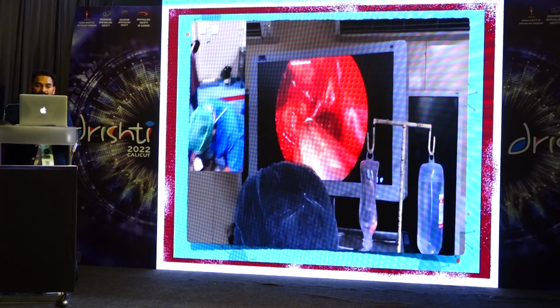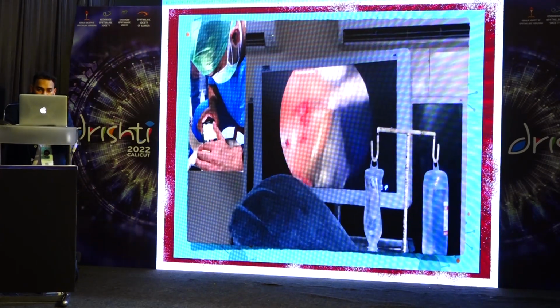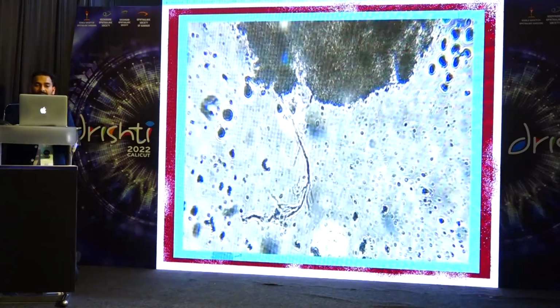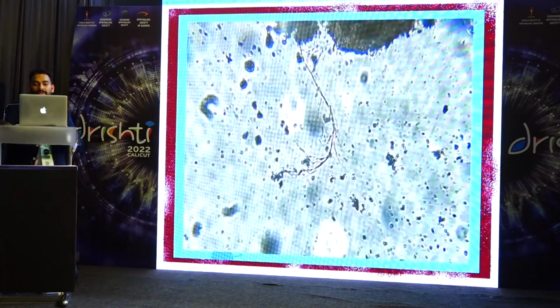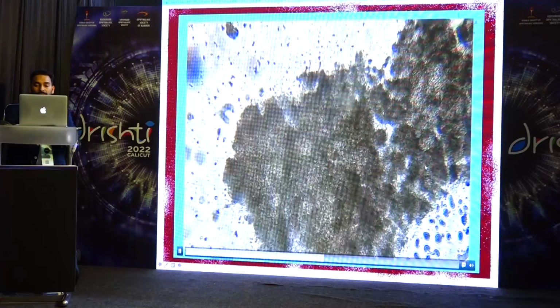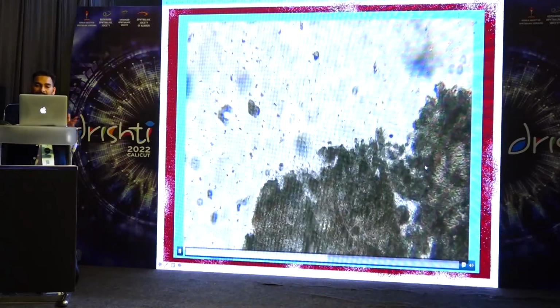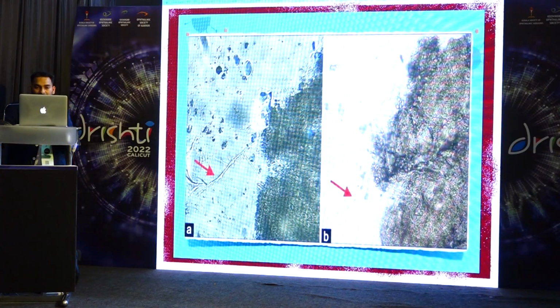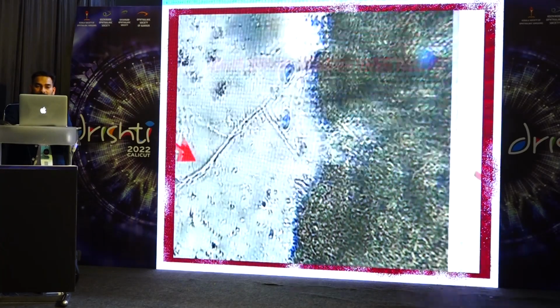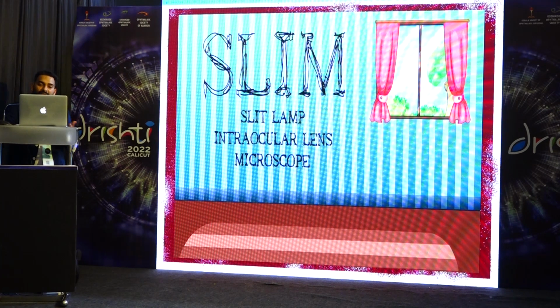During a live surgery, he gave a specimen from the paranasal sinuses, and we started cutting sections and checking for hyphae, and you can see over here such a big hyphae material. Just to prove that this was fungal hyphae, we took it to the microbiology lab and checked it, and it was similar. You can see how clearly it could be seen. We described this, and then the next was SLIM.